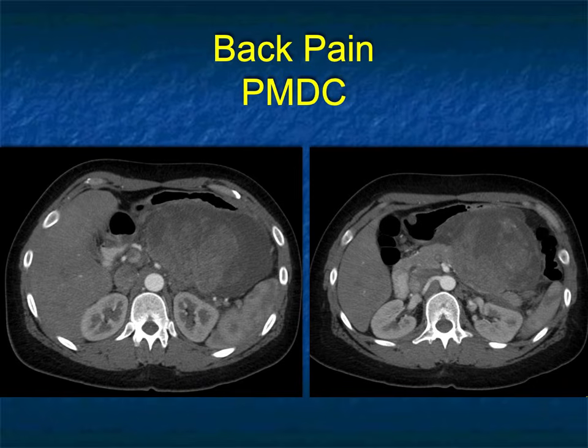Back pain, large mass pushing on the stomach by the tail of pancreas. If it came from the stomach, I could think about a GIST tumor. If it's just retroperitoneum, I could think about a sarcoma. Doesn't look like a liposarcoma. Maybe a leiomyosarcoma is a possibility. Big tumor. It's not an abscess, I don't think. There's no air bubbles.